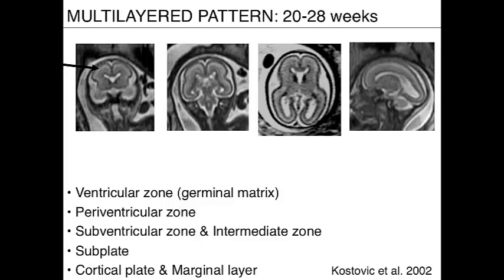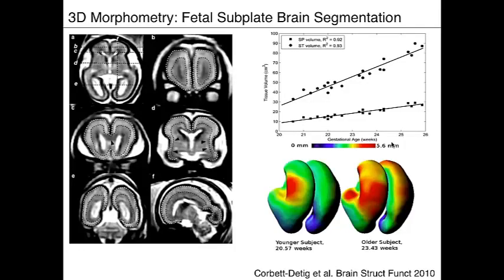This is an important transient layer in the fetal brain. It's the first site of synapse formation before the axons make their way onto the cortex, to synapse within the cortex. And then most superficially, we have a T2 hypointense layer representing the developing cortex. And this is seen on coronal images as well as axial and sagittal images, and it disappears by about 28 weeks gestation.